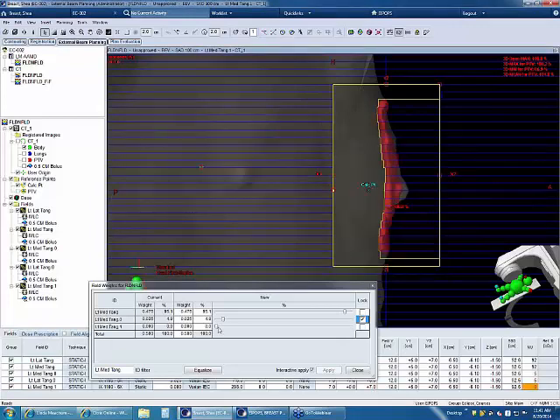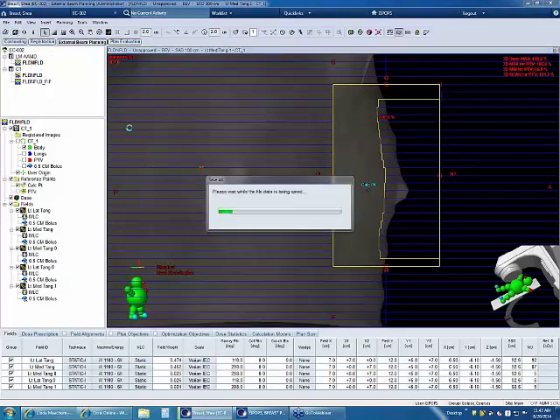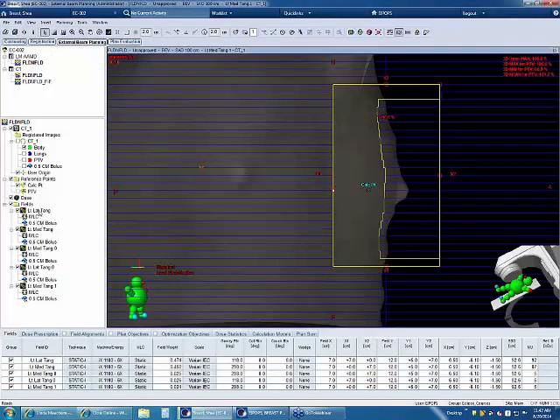And again, probably I'm going to weight it to where it comes out to about the first one because that gave me 5 monitor units. But that's not always a golden rule. I want to do it until that line disappears. And let me go a little bit more. Awesome. I'm going to close it. I'm going to save it. I'm down to 106.6 hot. We'll go one more. So that was my left medial.